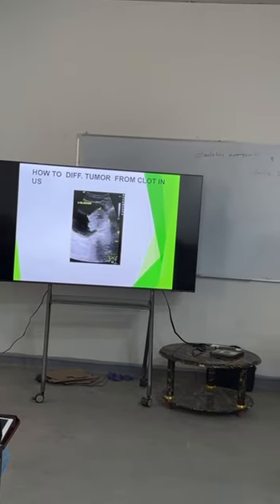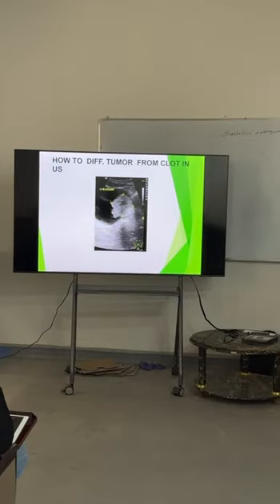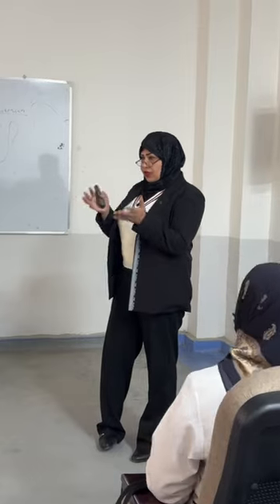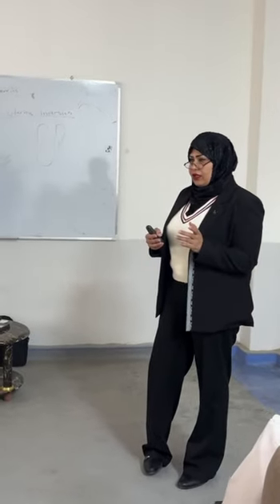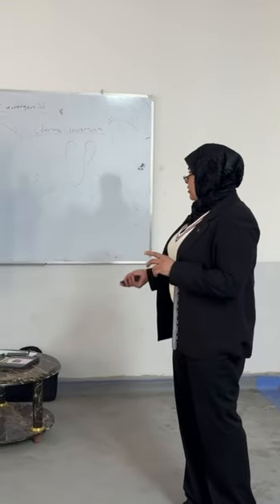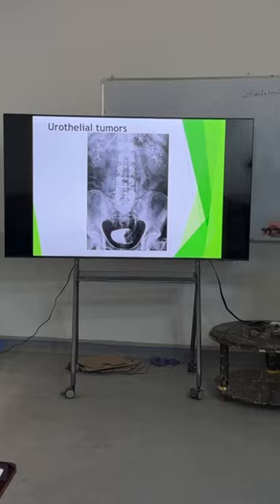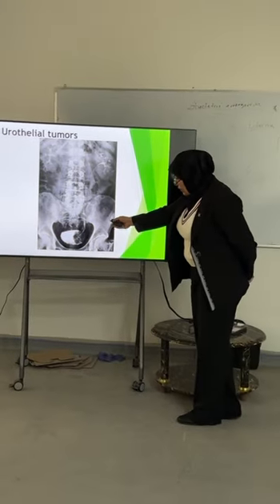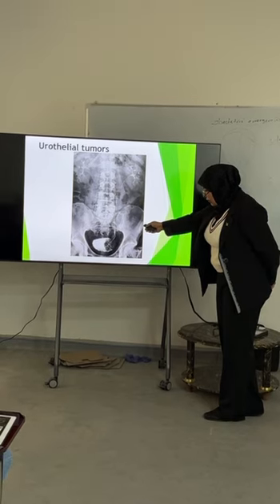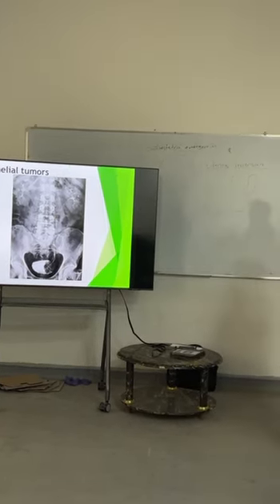By movement? Yes. If it moves, it is a clot; if not, a mass. If it is moved, we can turn the patient upside down. If the mass moves, it is a clot. If not, it is fixed, it is a tumor mass. And look at this, another lesion within the urinary bladder involving the wall, appearing irregular, and involving the lateral wall and lower ureter. It is also a ureteral tumor.